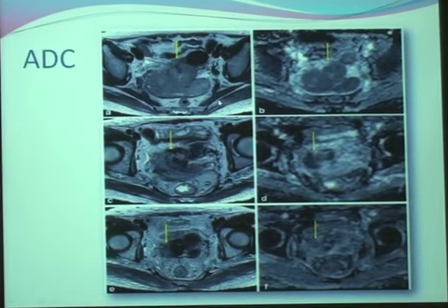ADC, or diffusion weighted image, can also be used to monitor the treatment response. Again, this is sequential imaging of another patient. We can see there is marked decrease. This is the mass. There is marked decrease in the size and in the segment of the affected area.